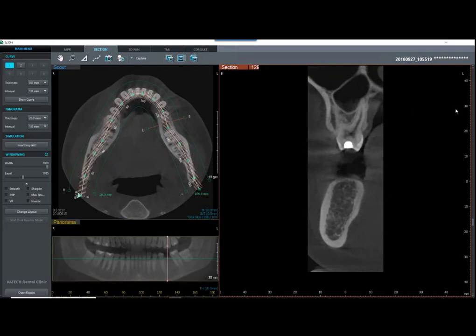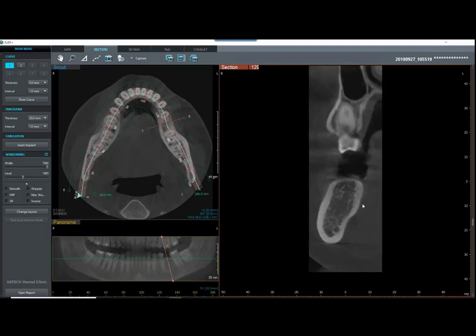So one thing that is really nice about the software, we get a lot of likes for this, is we can rotate this line here, because right now I'm slicing vertically through that implant site. I want to rotate this site. So what I'm going to do is come here. We're going to go ahead and rotate, and I can use the wheel on my mouse and go across here, moving through our slices. So let's move this up a bit, and right now we've kind of have this set up, maybe moving into our first clinical tools of implants there. Paul, do you want to kind of walk us through going through implants here for site number 19?